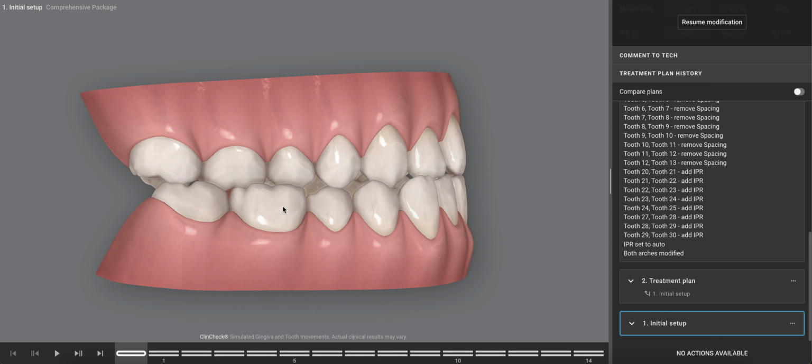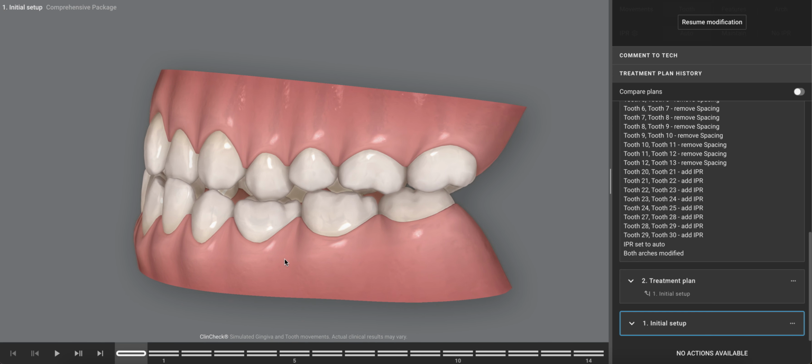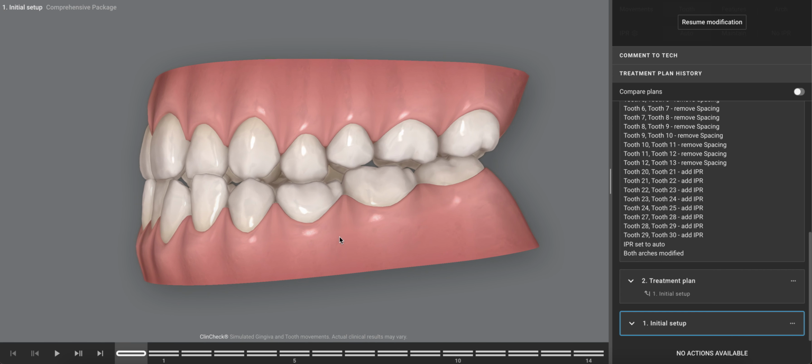which leads us to a class 3 dental relationship, both with the molars and the canines on the right side, and then on the left side that also holds true, but I think it's exacerbated by the presence of a retained lower molar. Because primary molars occupy more mesial-distal width, whenever we have a retained primary, we're going to have an exaggerated dental sagittal discrepancy. So this will exacerbate the class 3 relationship.